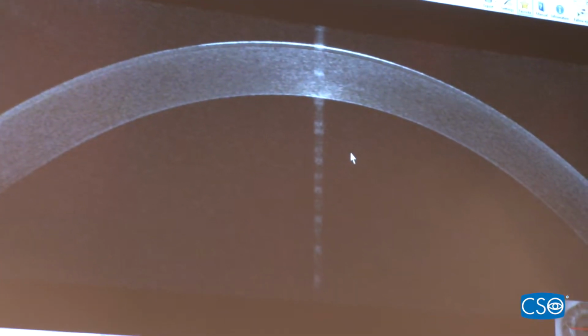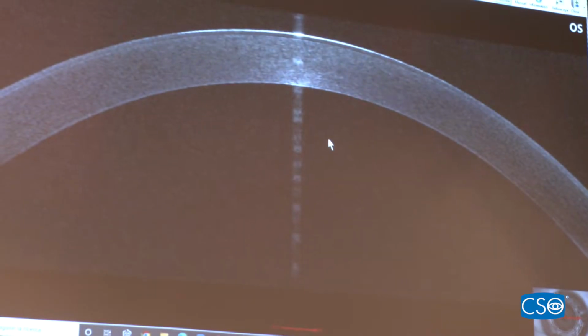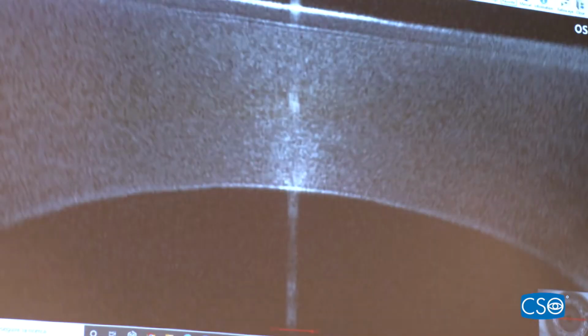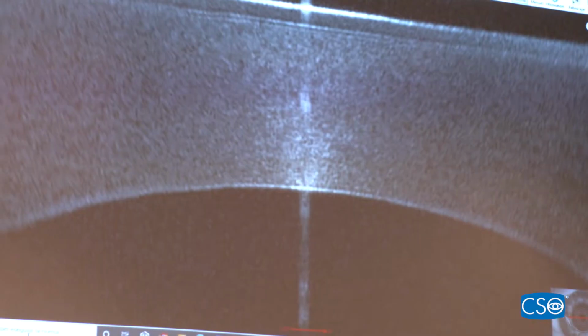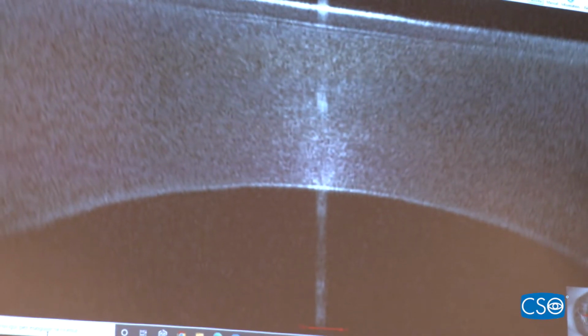But the idea that we had, and we started doing this with ultrasound in 1991, where we would put the front surface, we would make the front surface flat. And then for all of the other surfaces, the relative curvature is much more obvious.